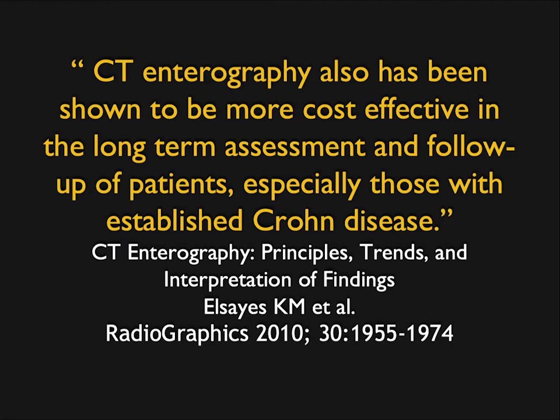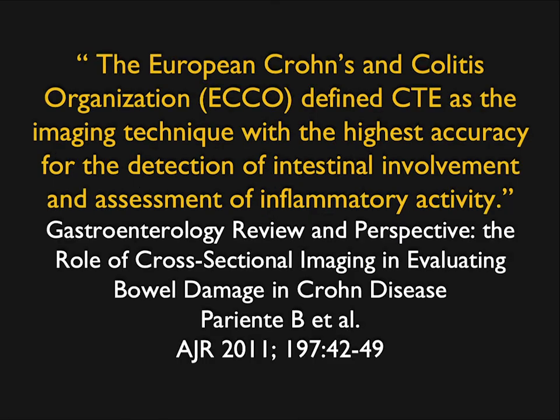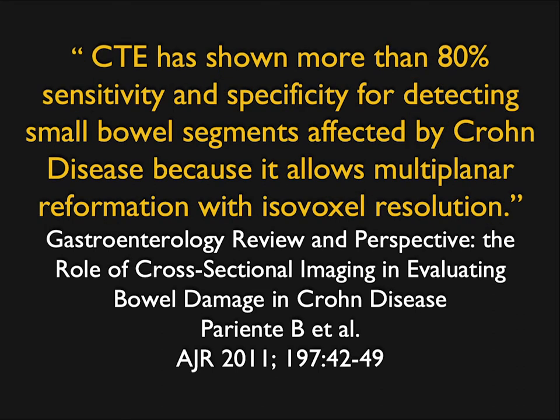This whole idea about CT enterography, I've spoken about that before. So just to remind you that CT is excellent in Crohn's disease. We try to balance CT and MR to minimize patient dose. But again, the intestinal activity, the inflammation, the bowel distension, very, very high accuracy. And again, as noted in this article, the coronal views can be very helpful. We use coronal, we use volume rendering, we even use cinematic, but looking only at the axials tends to underestimate exactly what's going on, and transition points are often hard to see only on axial imaging.